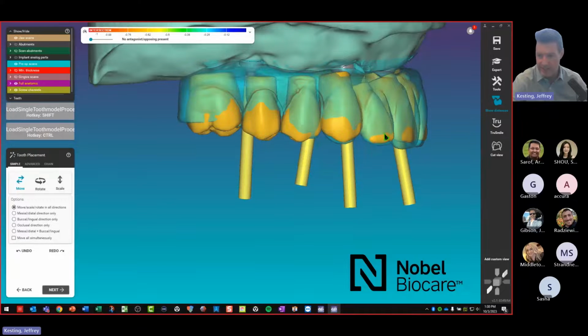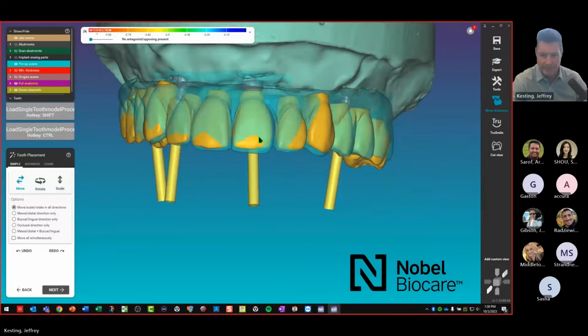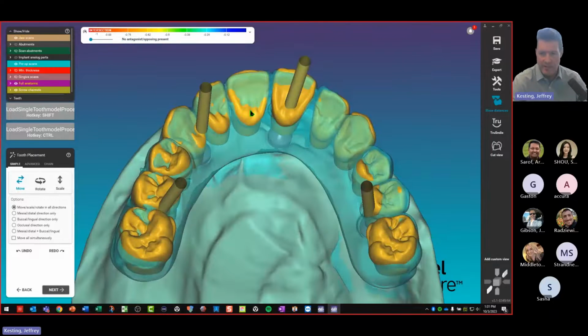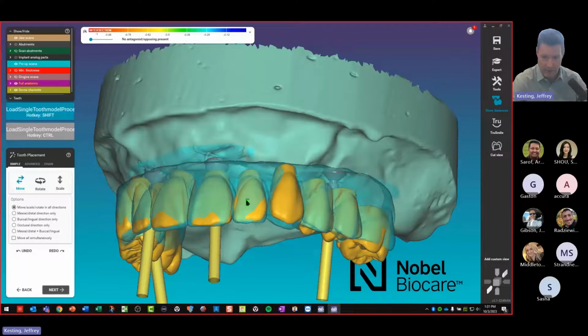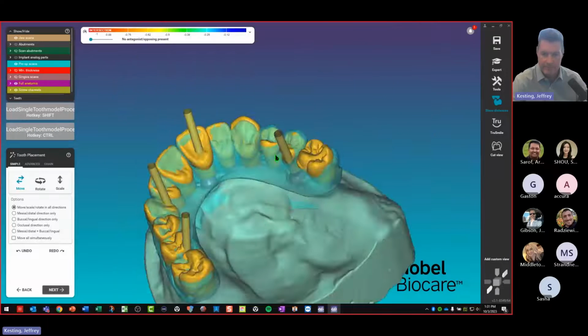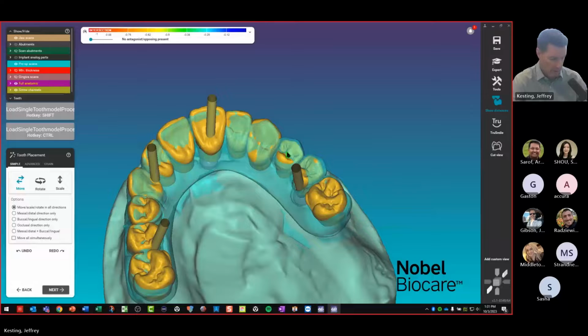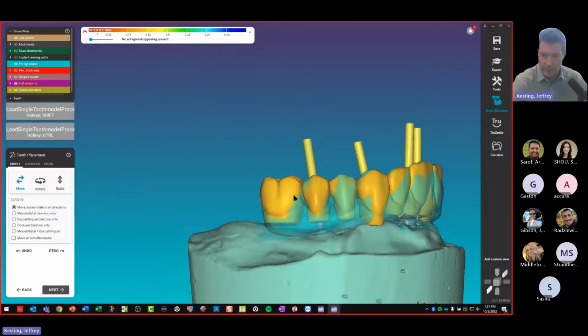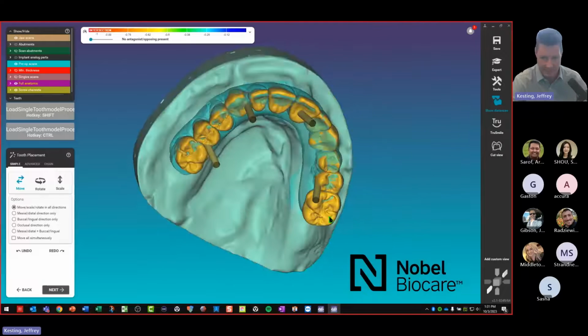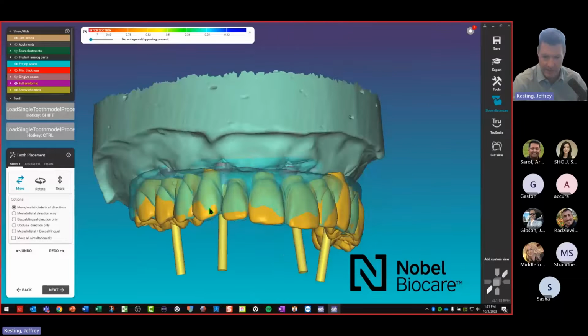And we can move teeth. Just do this really quickly. Obviously, you would spend time here designing your real bridge to get these exactly where you need them to be for the case, but I'll just do this very quickly so you can see some of the other design controls. Make these just a little bit bigger here. Okay, so we can get this looking a little bit better here. We'll say that is fine for this, just for this, moving on here.